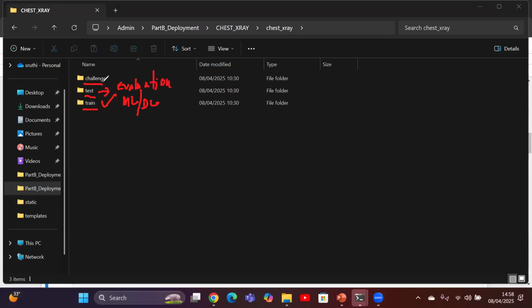And we will also have some more data. I'm giving it a fancy name, challenge. This is nothing but validating with new images, because we already trained the model and tested the model, but we wanted to ensure whether it is working well or badly using new data. That's called challenging data. That's how some people say validation. So we will be using the name challenging the data. I hope this is clear. We will go back to our module and back to our Jupyter notebook.